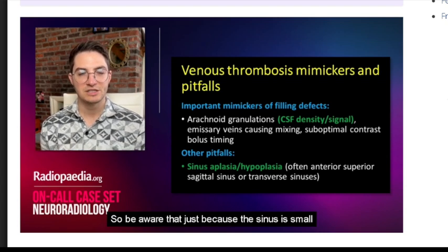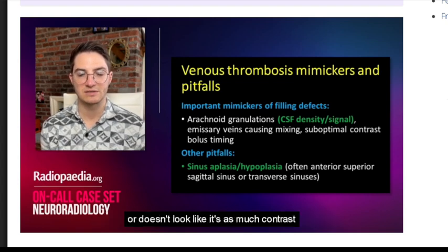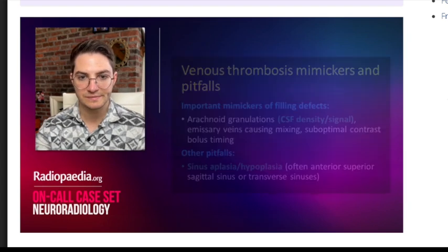So be aware that just because the sinus is small and not really getting as much contrast as the other side, or doesn't look like it has much contrast, that's different from a filling defect where the sinus is normal caliber, but it's not getting any opacification because there's clot in there. So just be aware of those pitfalls.